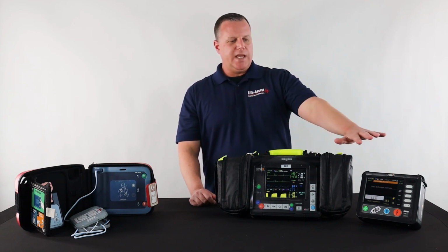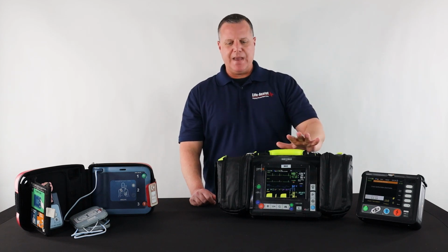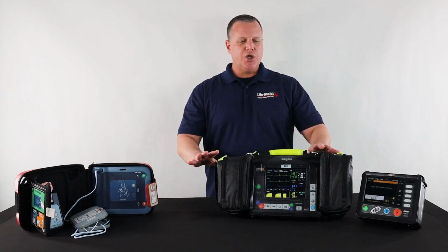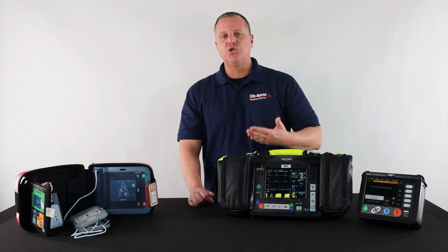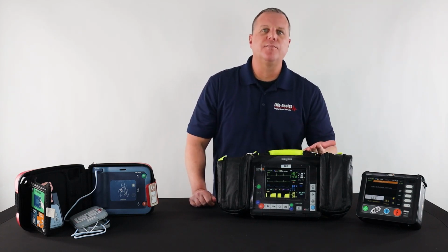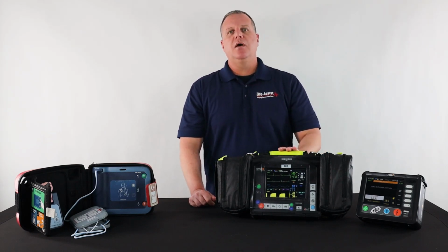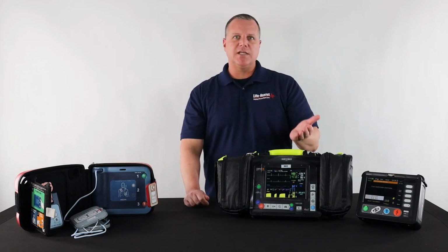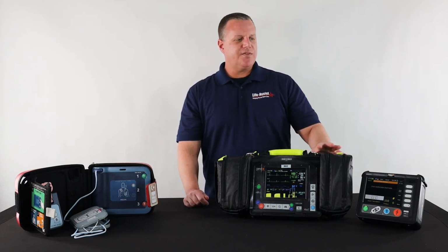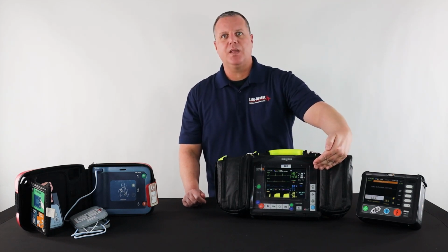Again, for the age range, these are going to be exactly the same: adult, pediatric, infant, it doesn't matter. The only thing that would change is maybe the size of certain of the consumables that you're using. Like you're going to use a smaller blood pressure cuff for a kid. They have different size electrodes. The O2 sensors are specially made for different size people or different ages. So things like that, but the display on the screen is going to be exactly the same.